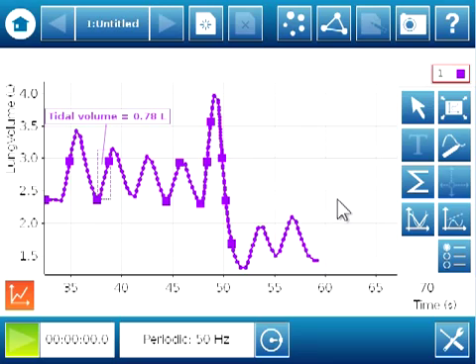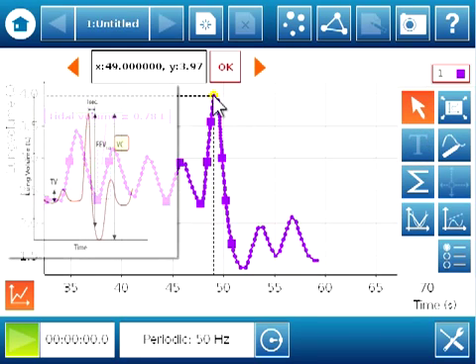So in the center of the graph, you'll now see that maximum breathing effort from the data I collected in part 1. So I took a deep breath and then forcefully exhaled as much air as I could out of my lungs. I'm going to use the Select tool again to highlight the region of interest.